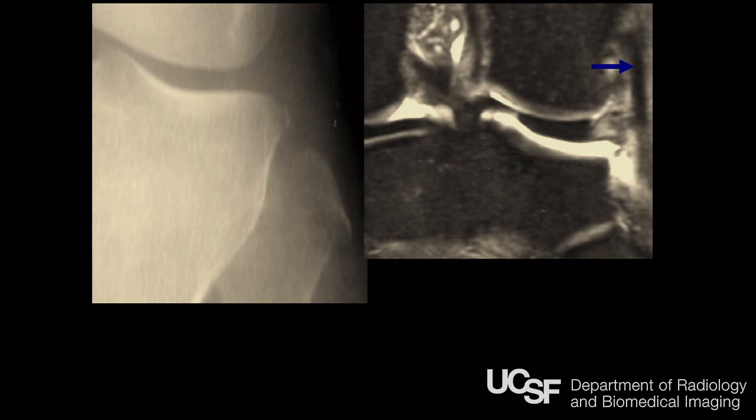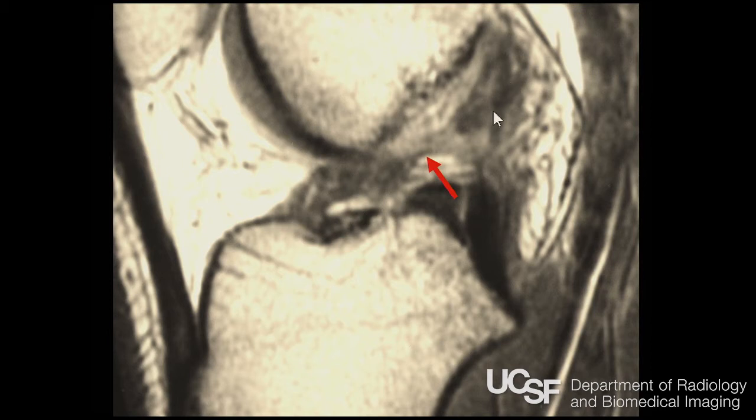When you're looking at knee radiographs, pay particular attention to the posterolateral corner and the lateral aspect of the tibia. Sometimes you'll see this little sliver. This is an avulsion injury off of the lateral cortex of the tibia. And sometimes you'll see an avulsion off of the fibula. When you see this, it's often associated with an ACL tear. So the Segond lesion is often associated with an ACL tear, and when you see that little tiny bone chip, don't blow it off. Say, oh, in that location, that's associated with an ACL tear, and then let the clinician know, they may have ligamentous disruption.